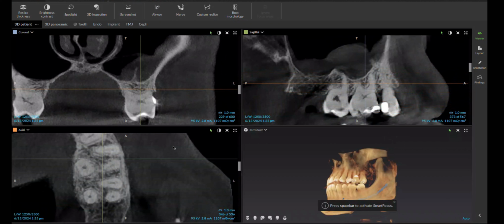What I found is by sending this to the ENT, and I'll often send screenshots of the CAT scan, find the best view that indicates what you're seeing. This right here would be good. And then you say something with a high degree of confidence, something to the effect of, through our thorough dental testing, we do not see any reason for this to be tooth-borne in origin or odontogenic in origin.